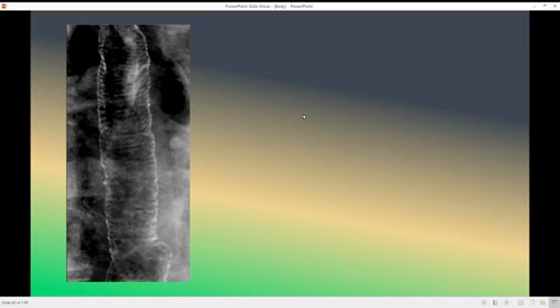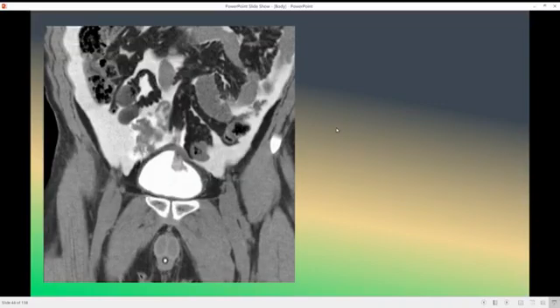What do you think about the next case? Okay, very good, Dr. Reem, Dr. Tariq Dawood, feline esophagus. This is a feline esophagus as we see here. This is a transverse fold involving the esophagus, and this is seen in cats, also in some human beings. We move to the next case. What do you think of the next case the patient has?